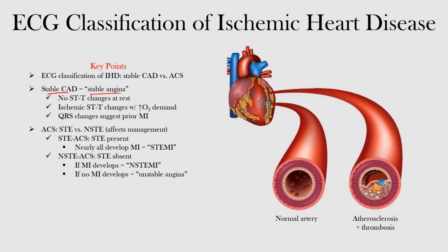Okay, so no ST changes at rest. However, if you increase any activity, if they're climbing stairs, now you're increasing the demand. And because of that increased demand, if we can't meet it with more oxygen supply, we'll get these ischemic STT changes with that increase in demand.